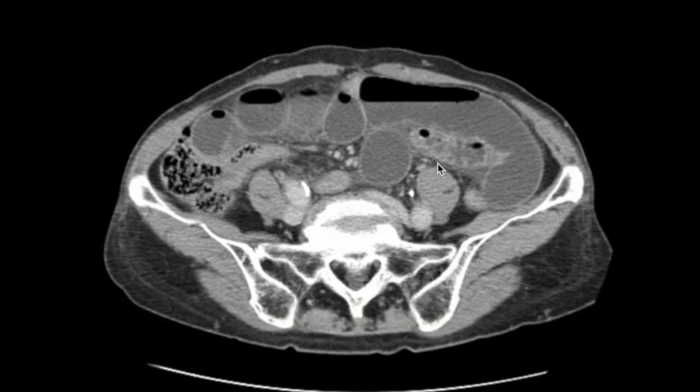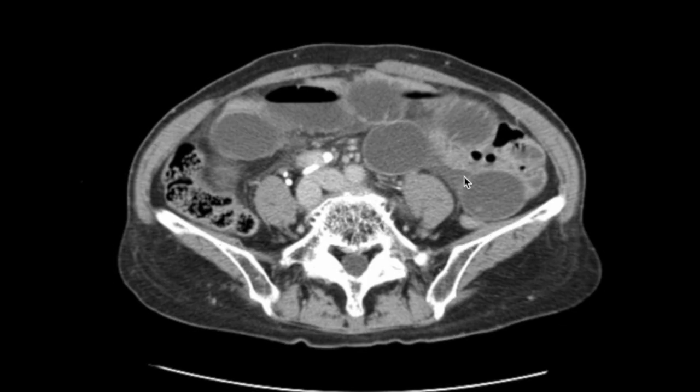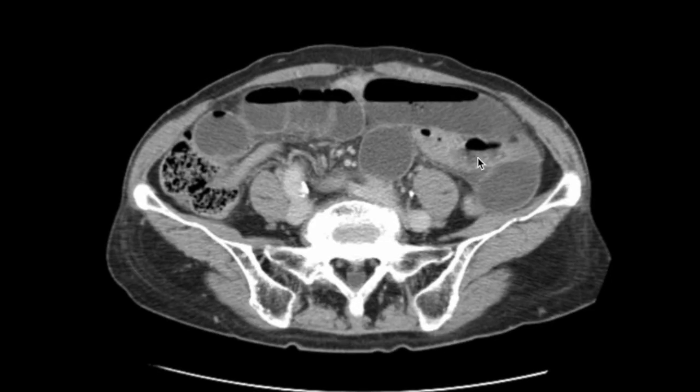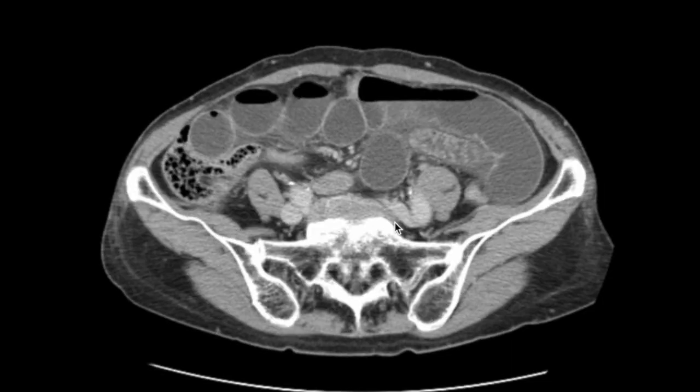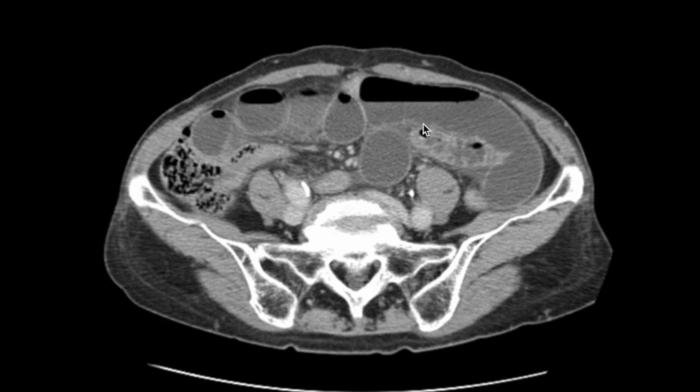Normally, the digestive tract is constantly wriggling due to peristalsis, so the digestive fluids and gas inside don't separate out neatly. Instead, they mix, ripple, and appear disorganized. But in ileus, the intestine is not moving at all. So the fluid and air remain motionless and simply separate neatly under gravity. In other words, this niveau is proof that the intestine has stopped moving.